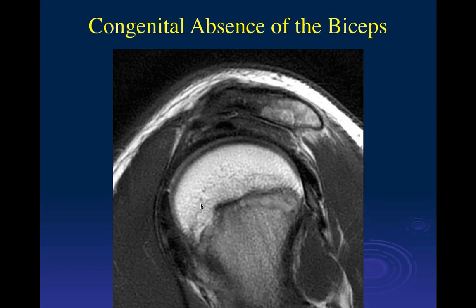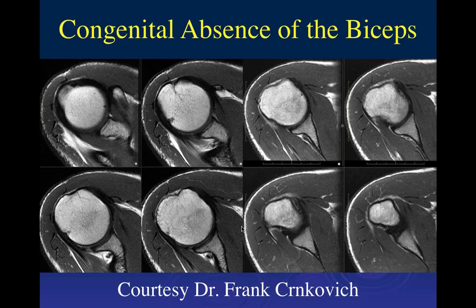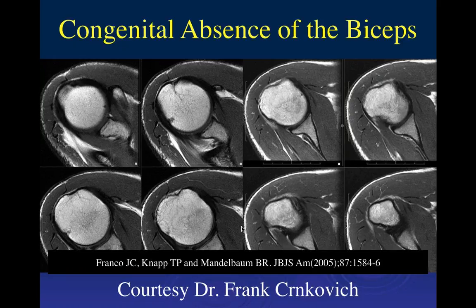Was this only the long head? Yeah, only the long head. Okay, and here's just another example where we don't see the intertuberous groove. We don't see a biceps tendon. This is a 23-year-old male, and this is another congenital absence of the biceps tendon.